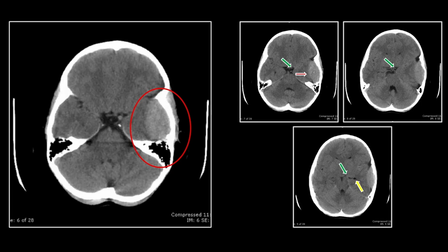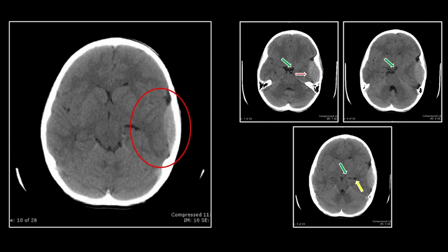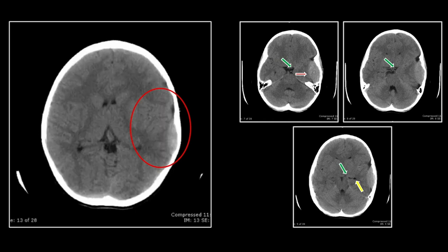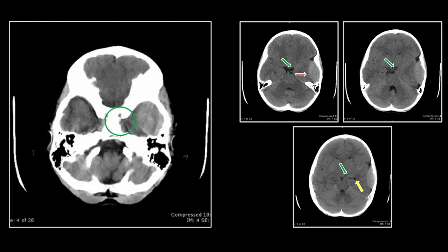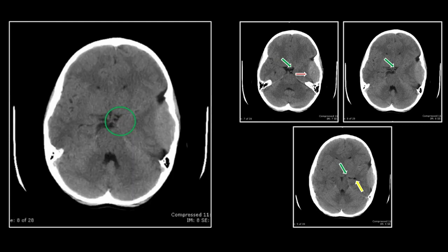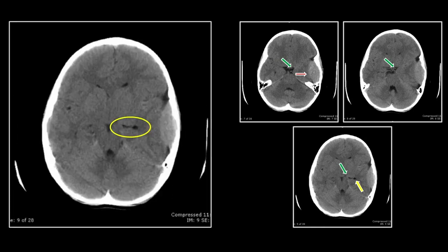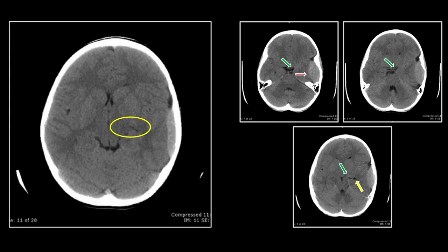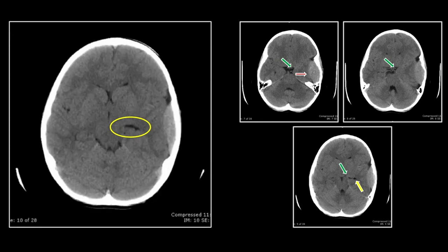See here again the extraaxial lentiform density not crossing the adjacent skull sutures. And appreciate the medial displacement of the uncus and distortion of the cistern. And lastly, we'll take a dedicated look at the dilated, elevated, and distorted inferior horn.